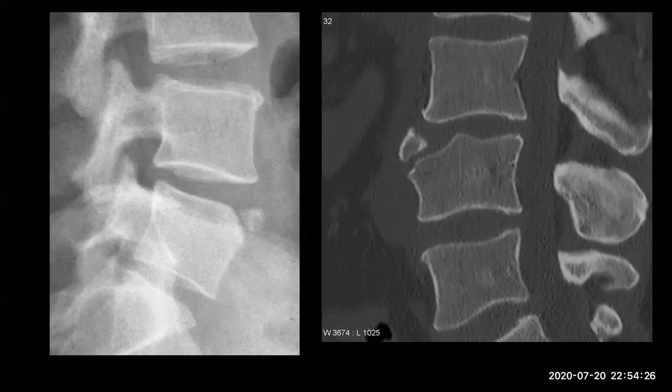Here, limbus, because it is corticated, and it is corticated because of the location at the anterior superior part of the vertebral end plate. Well corticated. It is surrounded by what? End plates, exactly, yes. So this is limbus vertebra.